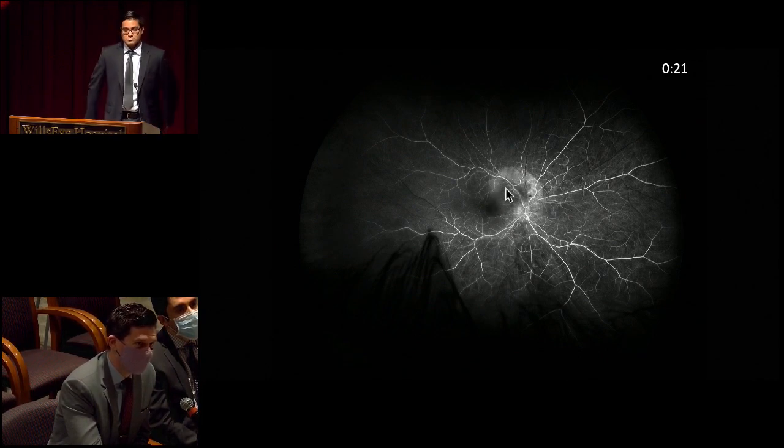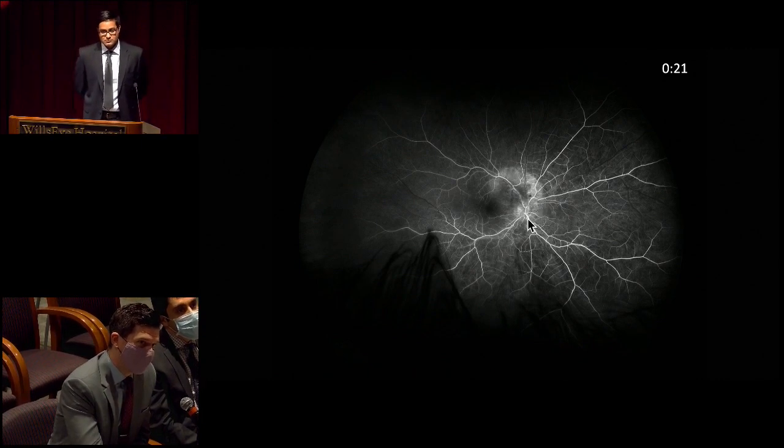and it appears to be deep to the vessel, so possibly the level of the RPE choroid could be, given this early frame, a window defect versus early staining here. There is some hypofluorescent signal in the center of this, unclear if that's due to possibly blockage versus truly decreased perfusion there. And again, the macula itself, at least at this phase, doesn't show any frank macular edema. The disc is a little bit blurred again superiorly, but too early to say whether there's disc leakage.